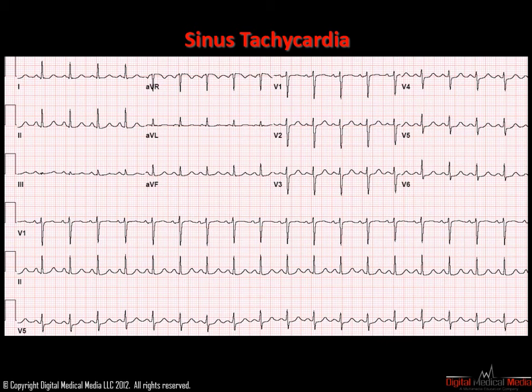The mechanism for sinus node reentrant tachycardia is again built into the name itself. Reentry, or an abnormal circuit, is present within the confines of the sinus node complex. The circuit forms a loop inside the sinus node, which, once it begins, spins around very rapidly, each time sending out a sinus P wave. This rhythm cannot be distinguished from sinus tachycardia, whether appropriate or inappropriate, on a 12-lead ECG. Therefore, even if sinus node reentrant tachycardia is the actual diagnosis, the ECG interpretation is again sinus tachycardia.